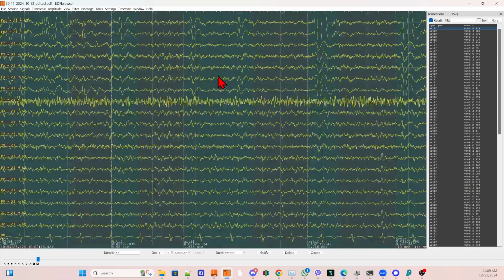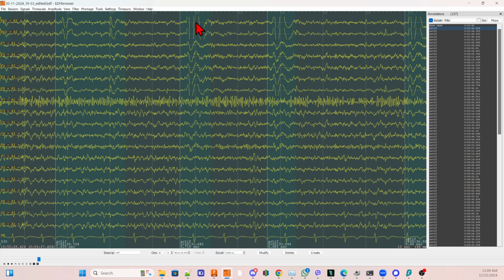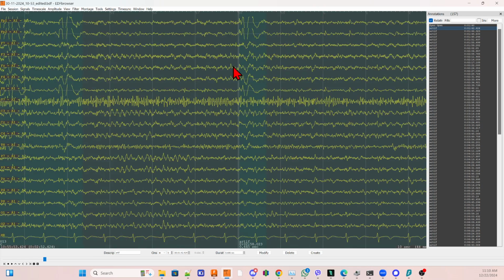And so I keep doing that because we want to have the clean data. We want to have the data snippets in between. So here, in between two eye blinks, I'm having 1.5 seconds of clean data. And that's what we're after. So it keeps going like that, and so you can see how I've annotated this.